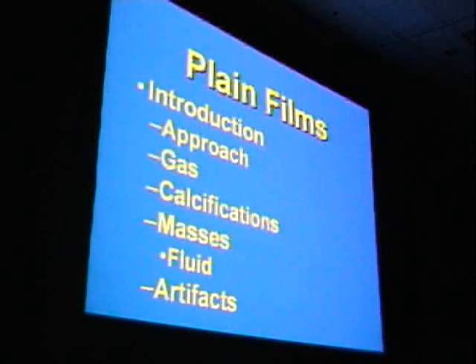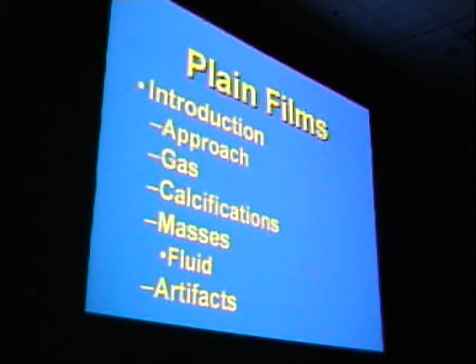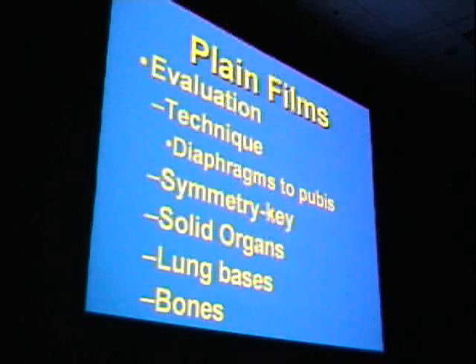So let's talk about plain films. Again, an approach. I'll go through an approach as we go through the cases. Talk about gas, calcifications, masses in terms of fluid and artifacts. Now, I don't mention anything about the technique unless the technique does not include the diaphragms or is too light or too dark. There'll be a problem on the boards.